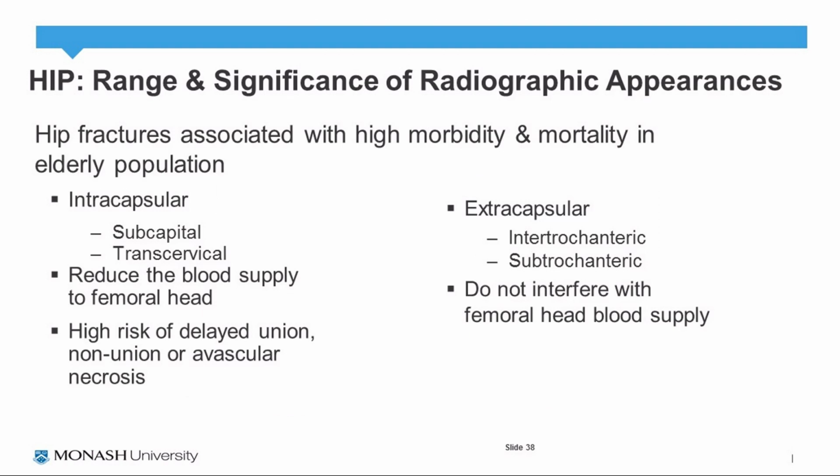Now when we move on to the hip, the main thing is to determine whether a fracture is intracapsular or whether it is extracapsular. And also to remember, in the elderly population, that it is associated with high morbidity as well as mortality.